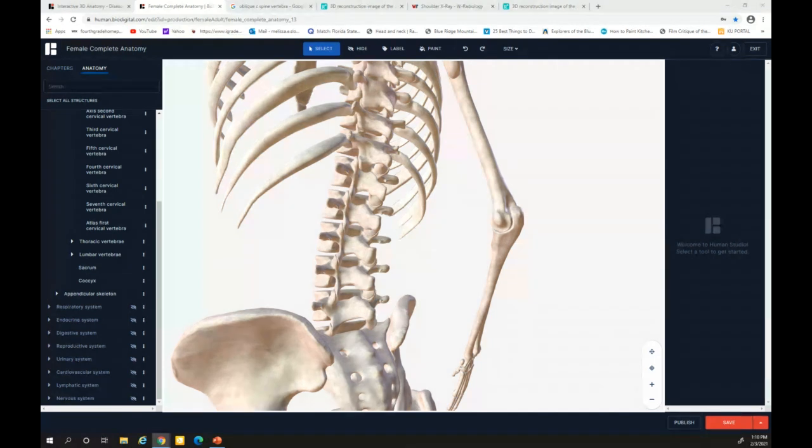So we've got elongated ribs, elongated ilium on the left side, meaning that the right arm, this right side, is down towards the bucky. Their ilium and their ribs, their left chest, is rotated away from the bucky.